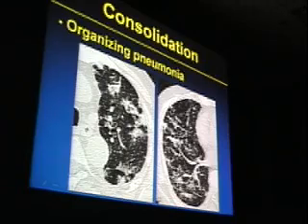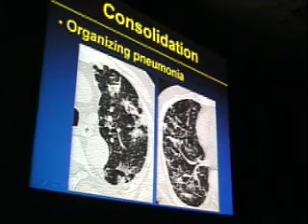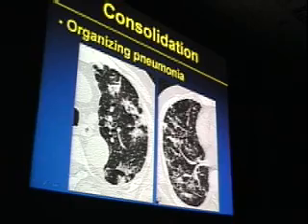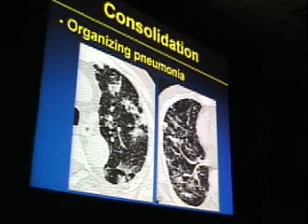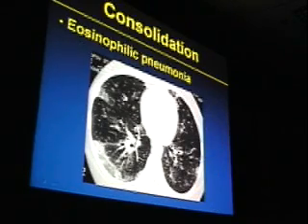It's another patient with organizing pneumonia, this due to amiodarone toxicity. Notice again these areas of almost mass-like opacity, rim of high attenuation, central area of ground glass, another reverse CT halo sign here. Notice also some scattered nodules. We may see some scattered centrilobular nodules, sometimes branching linear opacity, sometimes true tree-in-bud opacities in patients with areas of organizing pneumonia.